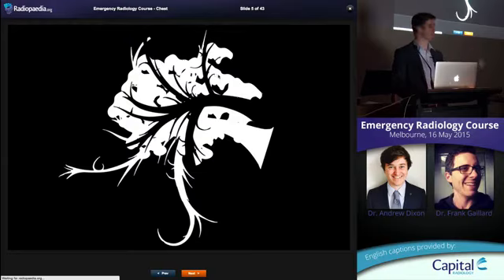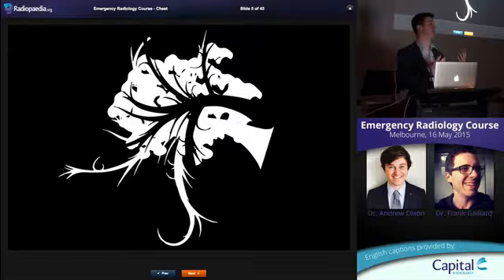So this is the same thing as the silhouette sign, it's just on a much smaller scale. Relative density difference tells you what there is, okay? If you're looking at a chest x-ray and you can't trace the vessels from the hilum, but you can trace some black branching things, then you've got some airspace opacity in there. Simple as that.